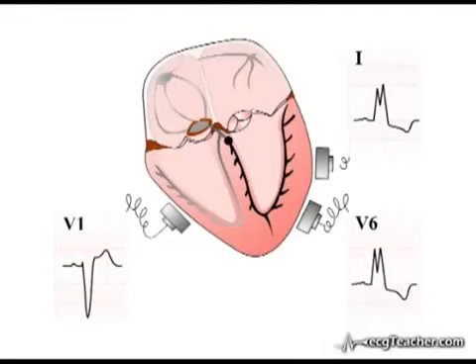However, just like right bundle branch block, although key elements of these morphologies must be present to make the diagnosis, the actual appearance of the complexes varies greatly between cases. In reality, the notch between these two positive deflections is frequently not as prominent as shown here. In this example, the M pattern is far less obvious.